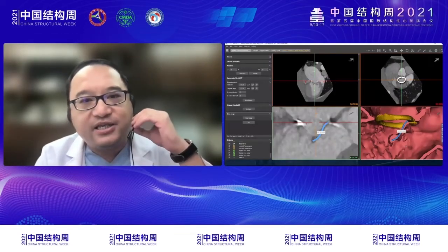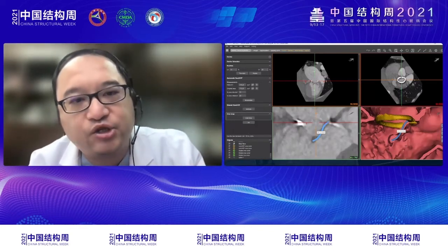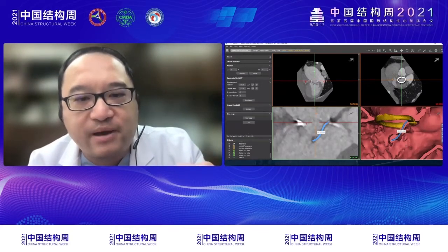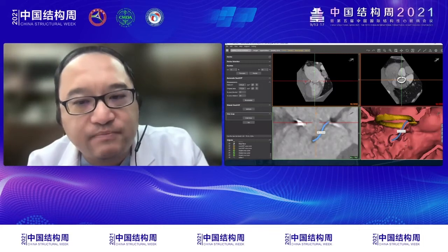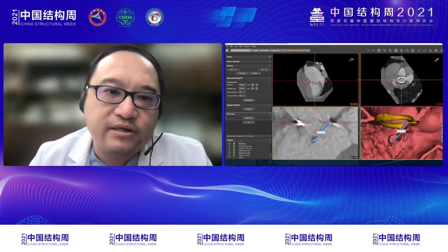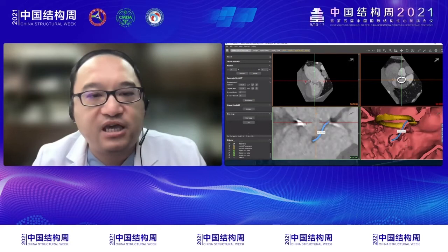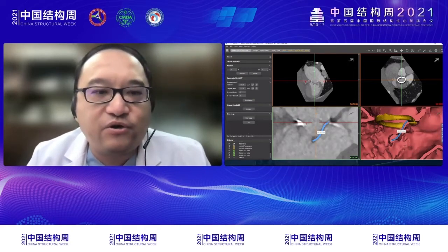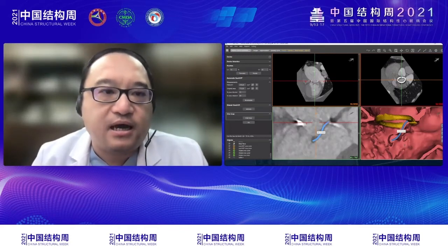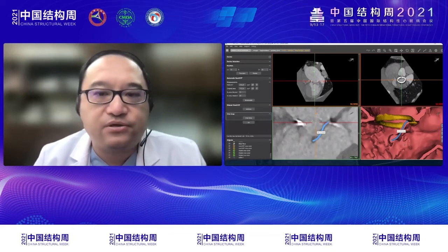Yes. But sometimes the tissue image quality is not so good. What I understand here is that just after the hollowing of your blood pool segmentations, somehow in this particular image the mitral valve becomes visible, but sometimes it's not that perfect, and sometimes we really need to directly segment a mask of the mitral valve itself. That is sometimes not easy manually. So I'm just wondering if there is any automated or semi-automated way to do that.